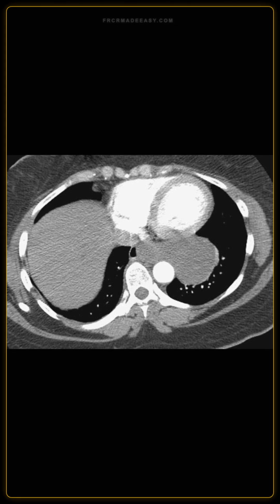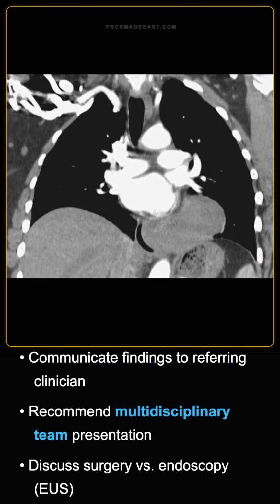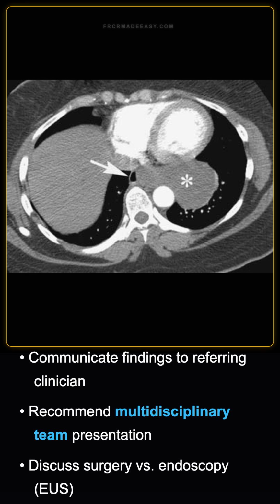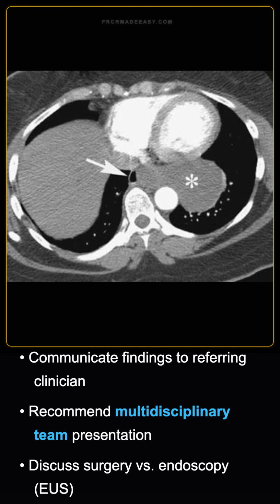How would you manage this patient as a radiologist? I would communicate the findings to the referring clinician and recommend presenting the case at the thoracic multidisciplinary team meeting. Given the patient is symptomatic, we would discuss surgical excision versus referring to gastroenterology for endoscopic ultrasound evaluation.